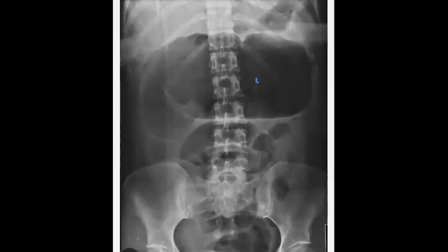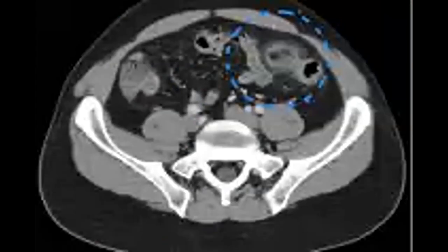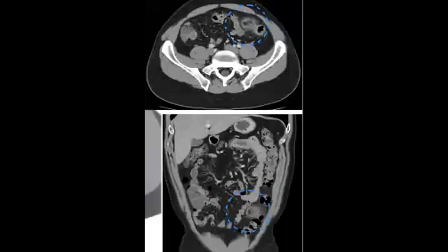In the exam, they also have one question. Let me show you an image with misty mesentery or misty fat around the lesion, like this one. Usually it happens on the left side of the colon, but it can also happen on the right side, and it affects the serosal surface of the colon. Yes, you would choose epiploic appendagitis.